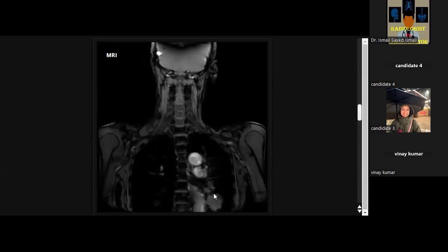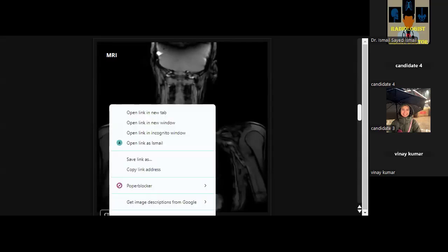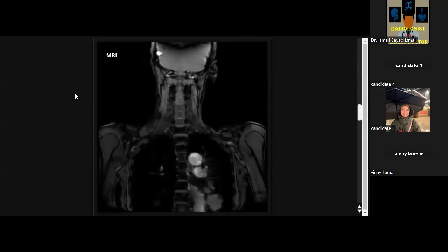Okay, good. I would like to review the T1 post-contrast images. Can you correlate these findings together? Based on these imaging findings, my possible differential would be intramedullary metastasis from a left hilar malignancy with adjacent cord edema in the cervical and dorsal cord.